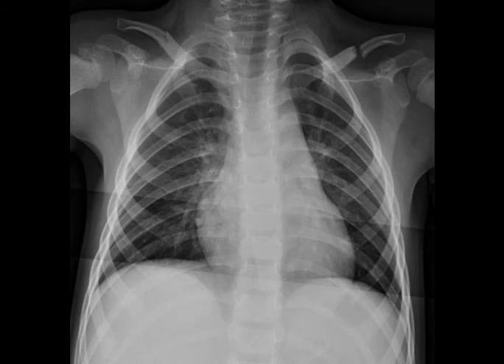Lastly, we'll want to evaluate the vertebral bodies, assessing that they all appear rectangular and of similar height, ensuring you can visualize 2 pedicles per vertebral body and that their disc spaces are present.